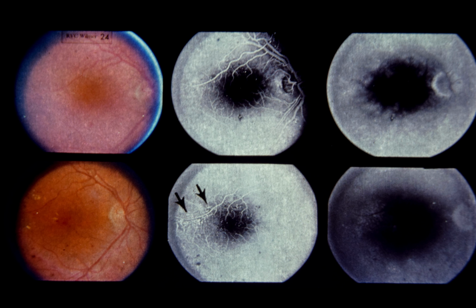Comment: this patient initially demonstrated asymptomatic background retinopathy. 1 year later, progression of microangiopathy and development of cystoid macular edema had led to reduced visual acuity. We have followed many other patients with background retinopathy for a number of years without any change in retinopathy and with no visual loss.